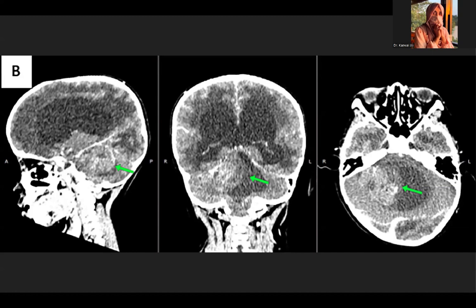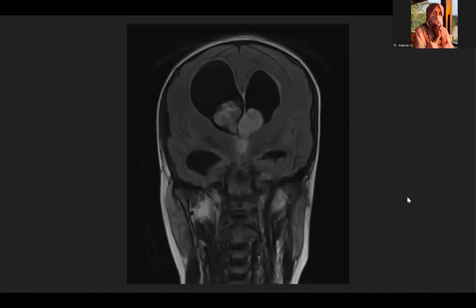So what is going on supratentorially here? Acute hydrocephalus, right? And we can also see some PVL here. There is edema around, even though the images are pretty low resolution, but we can be very sure that there is a hydrocephalus, and there is a solid cystic lesion in the posterior fossa in which the solid component is showing some calcifications as well, and it's also taking up contrast. Moving on to the next image, these ones are pretty stereotypical for how pilocytic astrocytomas usually look.